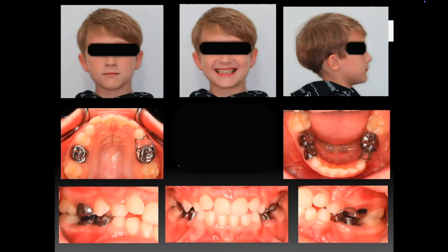So let's say we have 4 millimeters for argument's sake. Yeah, we might procline them and get some space. Right side, the same argument, that should be good, right? We have primary canine, we have primary first molar, primary second molar. On the left side, seems like we did a pretty decent job of holding that space. That band looks pretty thick, so we're probably okay on the left side. So there's less crowding on the lower than there is on the upper, right? When we're looking at the entire arch.